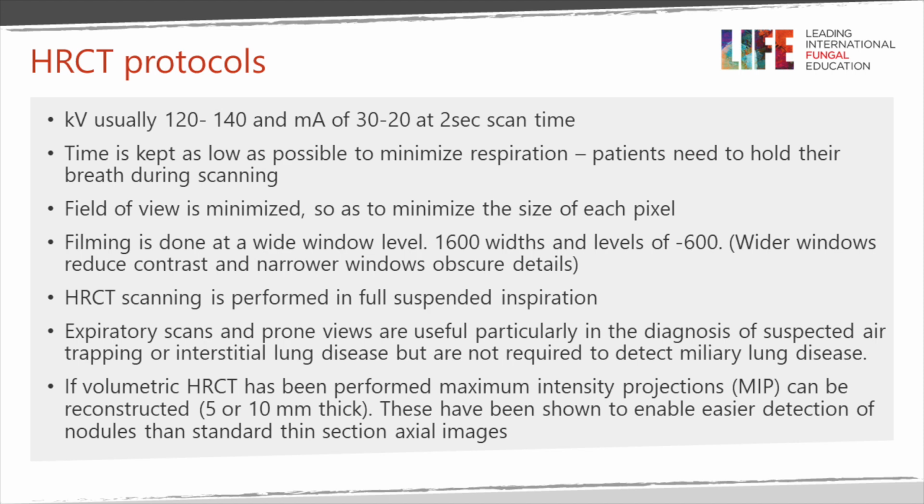I've mentioned a technical factor of keeping the field of view down to make sure that the resolution of the images is the best we can achieve. And normally these images are looked at on a computer monitor, but if you are filming then you need to look at it on a lung window, 1600 width, but also on a mediastinal window.